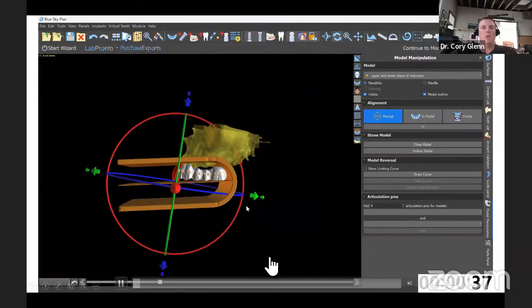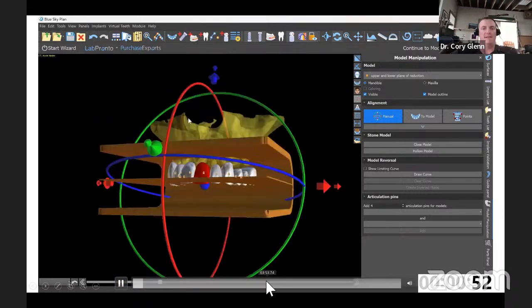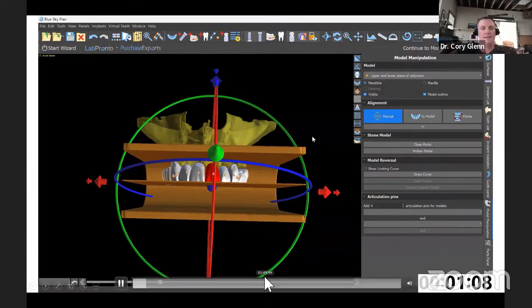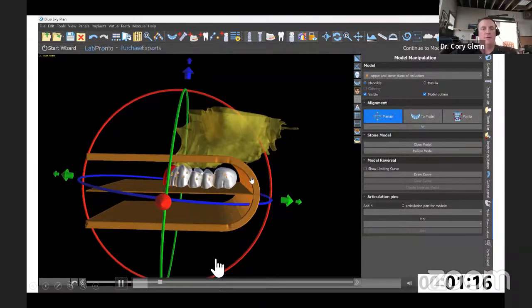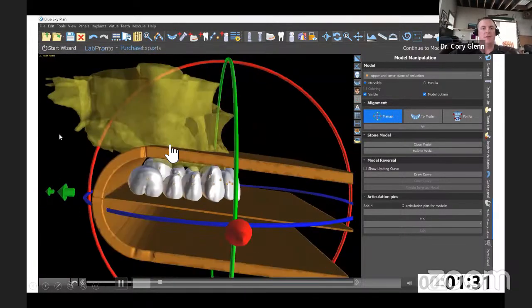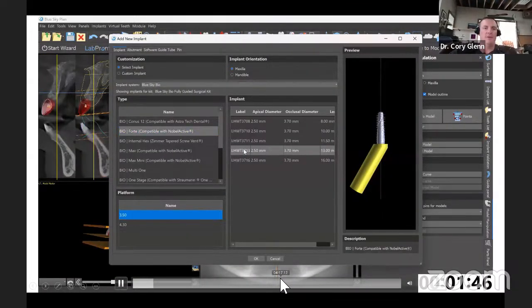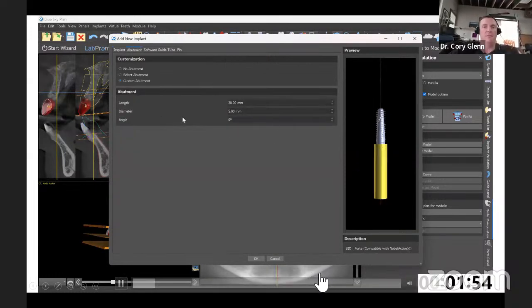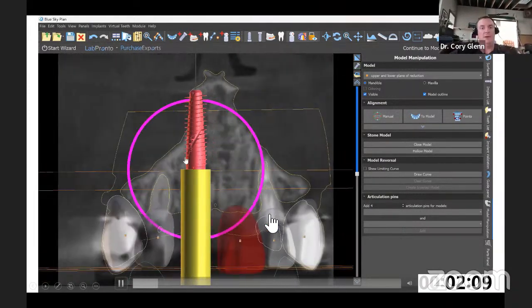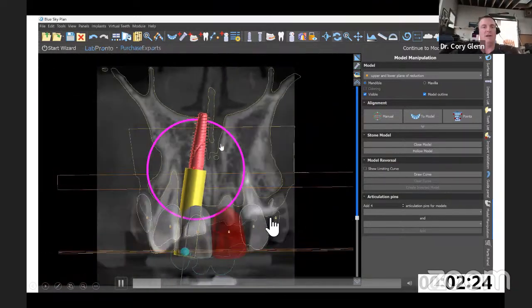Now what I want to do is position this. I want to get it going right along the occlusal plane, and it's easy to visualize that. I'll have the cusp tips just protruding through. I'm looking at this back area, and basically at my distalmost tooth is where I want to taper my cut out of the bone. I know there are other ways, and I've shown how to do bone reduction cuts and everything. This is just something new, like this morning new, that I'm doing, and I'm really liking it, actually. It's kind of nice to have that stock shape that I can just pull in.